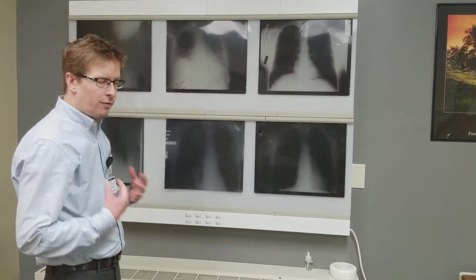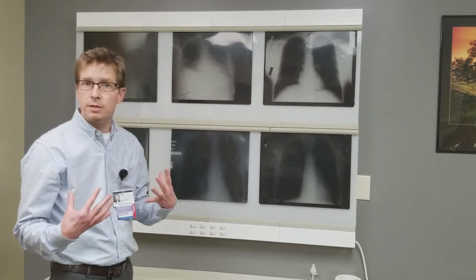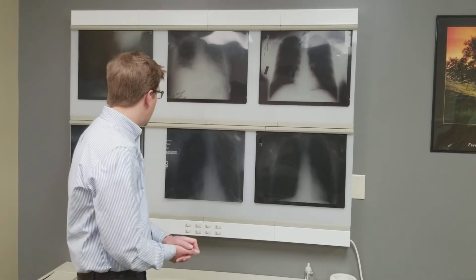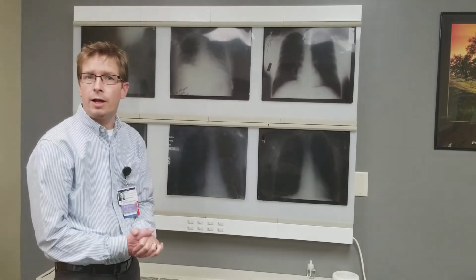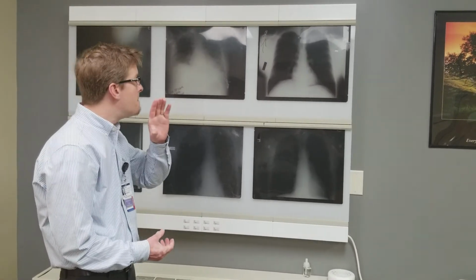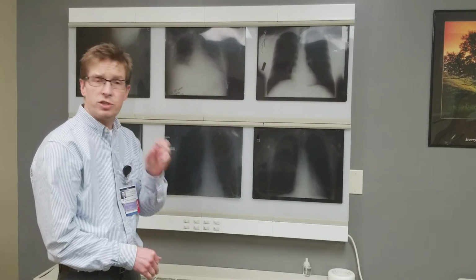In heart failure, look for increased vascularization and more fluffiness bilaterally. COPD, the lungs are going to be big. And in a pneumothorax, you're going to have a lack of lung markings. And these are basic things, and there's about a million things you could talk about with chest x-ray interpretation, but this is just a small little segment.